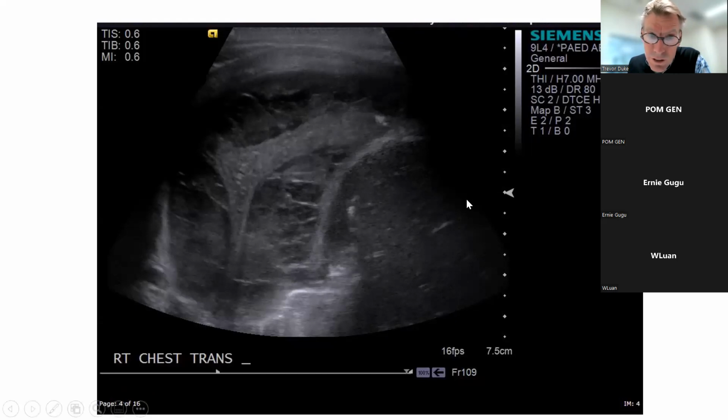Ernestine, you said quite rightly that this is the liver, and above the liver is what? The pleura, is it? The what, sorry, say that again. The pleura. Yes, even before the pleura. What comes before the pleura? Just above the liver. Diaphragm. Yeah, good. The diaphragm. That's right, Ernestine. What you're looking at here is the diaphragm. Okay, and then above the diaphragm should be the lung.